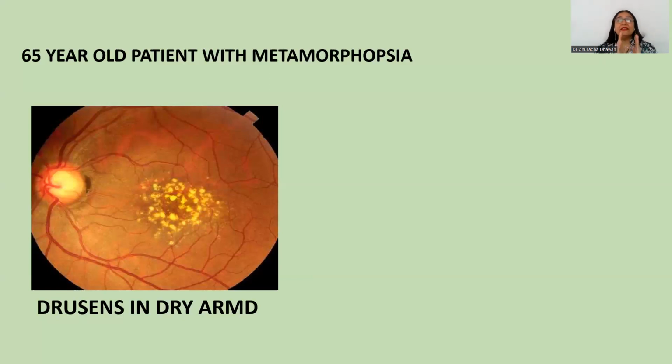Whereas this disease, age-related dry macular degeneration, does not have any vascular problem. Here, these deposits are actually debris. They are lipofuscin deposits. So if you notice carefully, there are no retinal hemorrhages, no microaneurysms, only yellowish deposits. If only yellowish deposits are there, which are actually deeper than the lipid exudate, but it's fine.